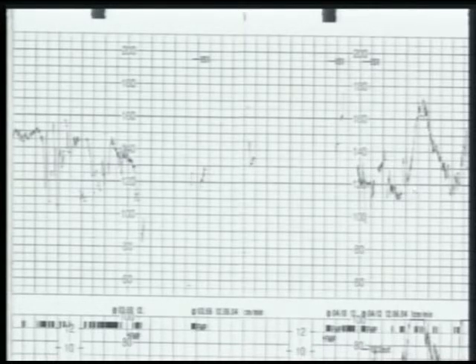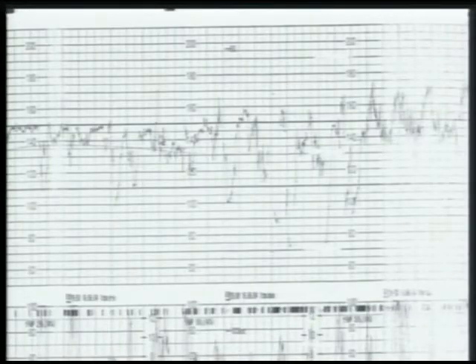The maternal heart rate accelerates because the blood is pumped into the maternal circulation, and she delivers about 35 minutes later, and the ABGs are poor, and they were saying, why did it become poor? Because there were accelerations, but they were recording the maternal heart rate. And this can happen suddenly in a trace.